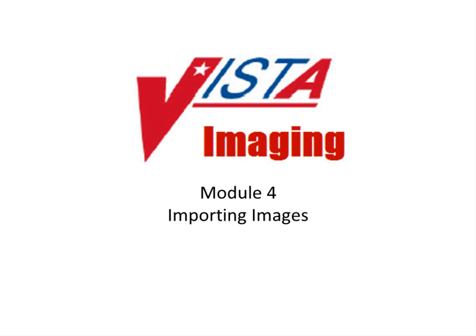This is Module 4 in the series of Vista Imaging Clinical Capture training modules, and it will cover importing images. It is suggested that the modules initially be viewed in sequential order to become familiar with the options necessary to perform document scanning and image captures. Importing images is similar to document scanning, so it is suggested that Part 3 of Module 3, Document Scanning, be viewed prior to this module.